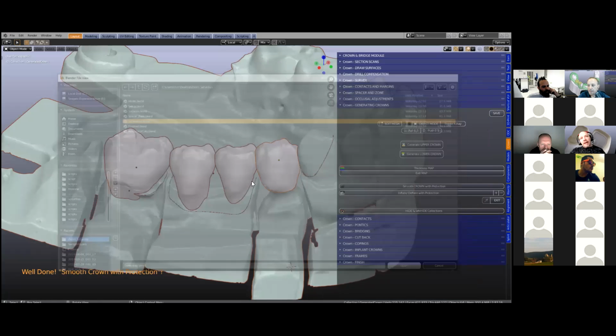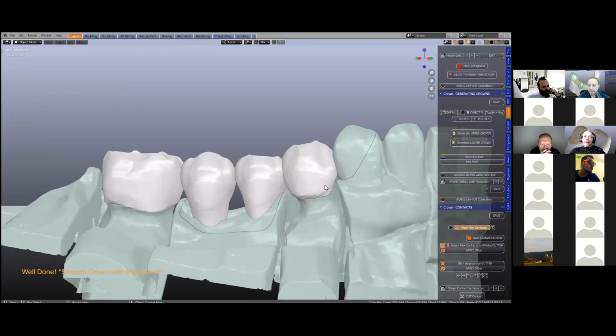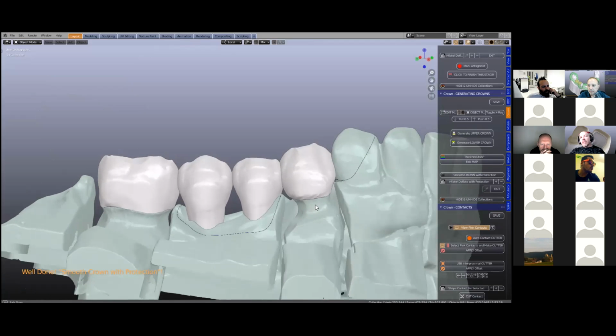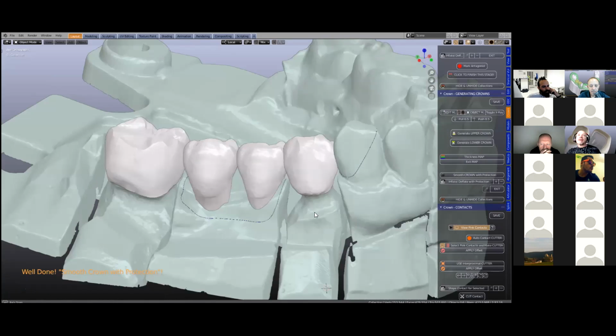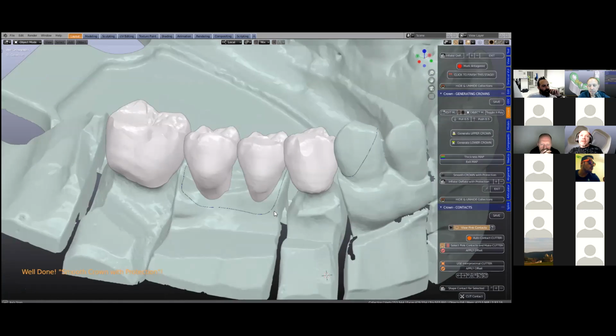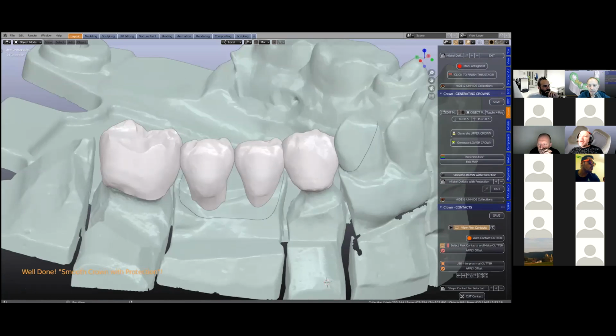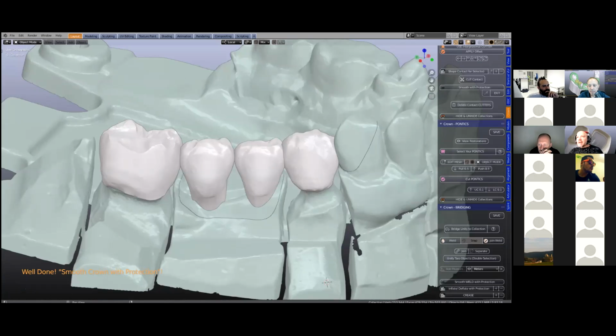All right, so here I've generated both of these just to save some time. It bulges out a little bit, but we can smooth that down, so that's not a real issue at all. The next thing we need to do is think about how we're going to connect all of these units up. That's quite easy, because we're going to go into the bridging of this whole thing.